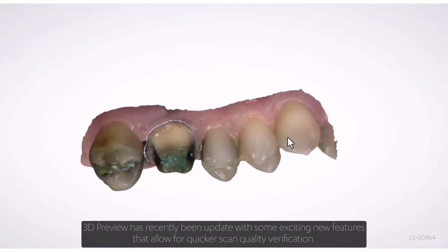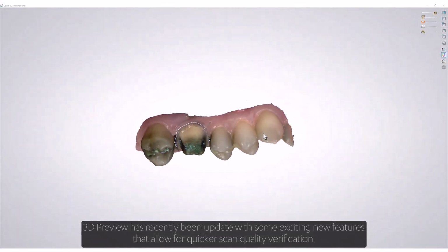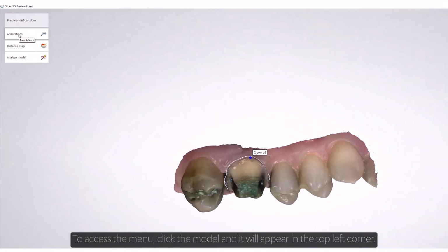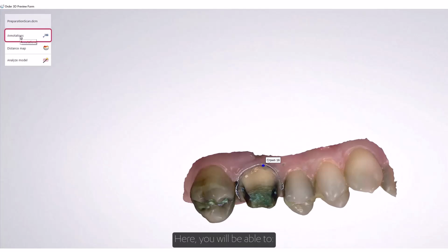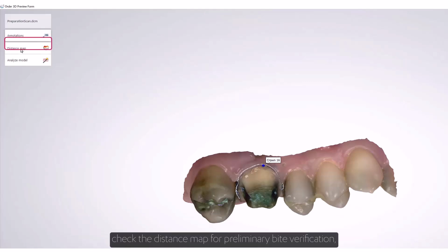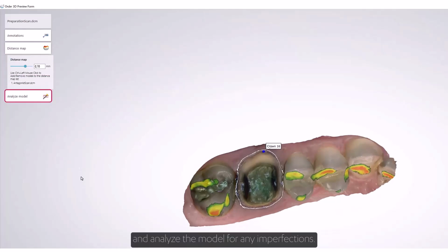3D Preview has recently been updated with some exciting new features that allow for quicker scan quality verification. To access the menu, click the model and it will appear on the top left corner. Here, you will be able to check for annotations to verify if the operator set the order form correctly, check the distance map for preliminary bite verification, and analyze the model for any imperfections.